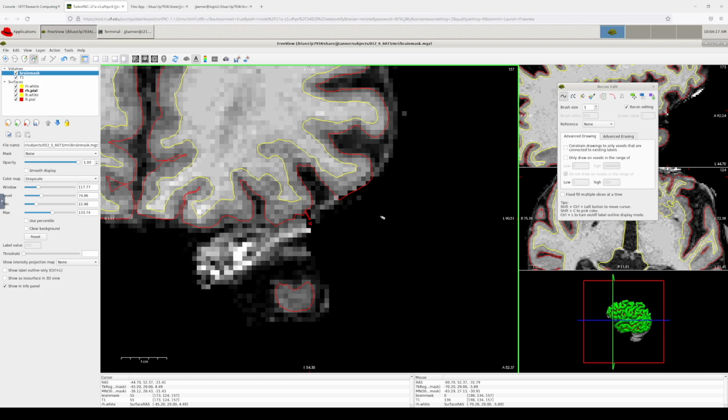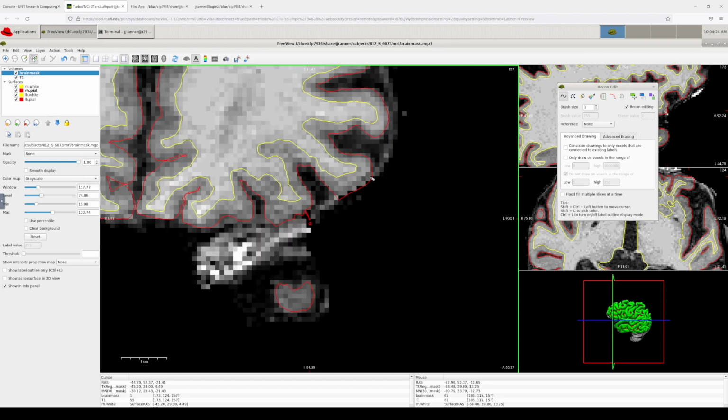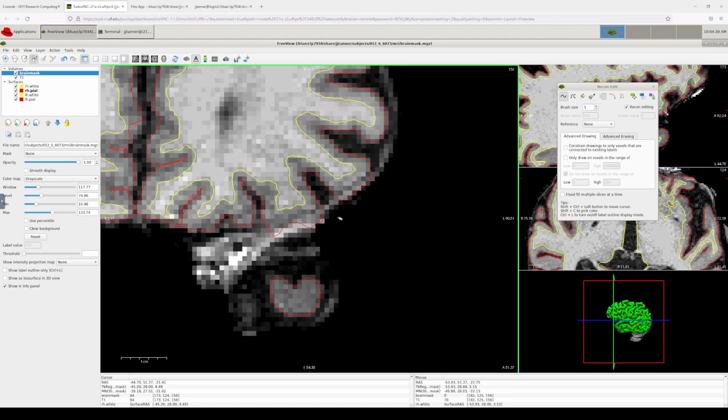And so then I'm going to go back one more step in the brain. Actually, I'm going to go forward. I could delete a few more from here. And again, this is being kind of slow because of internet things. But over here, this is one I'm going to fix. Again, I'm going to get rid of that, and then all of that can be deleted.